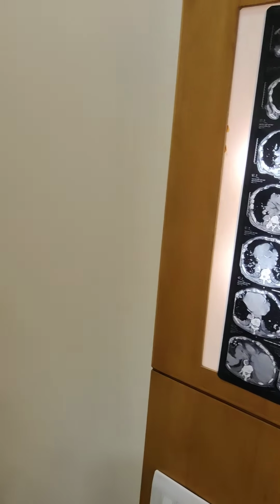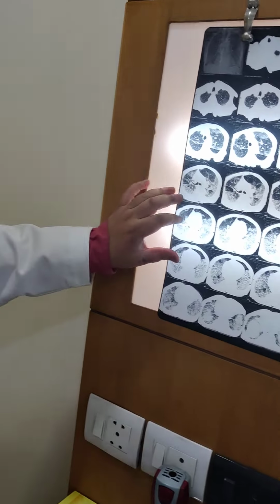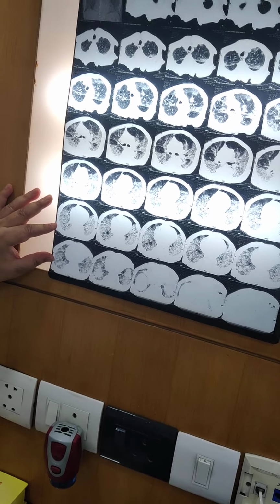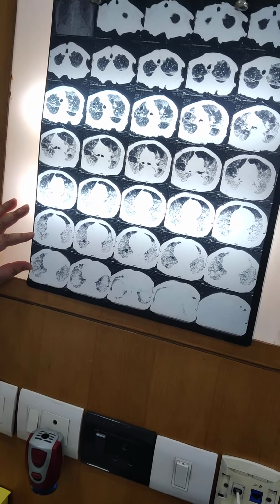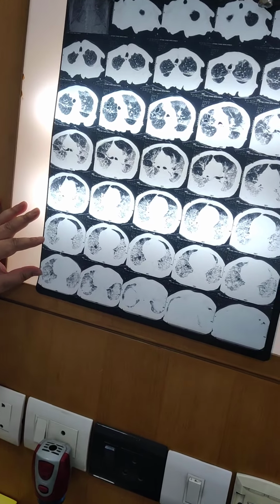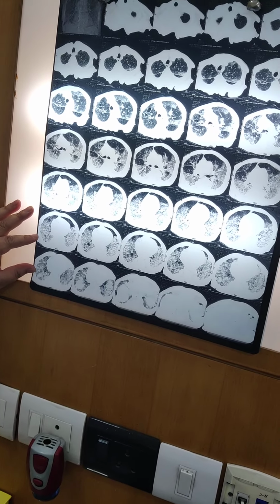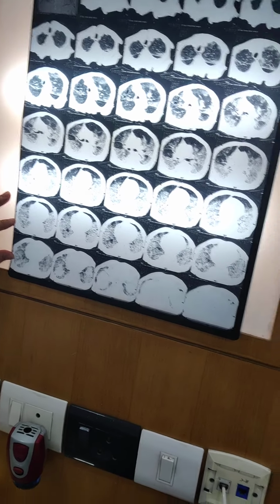And as I mentioned, if you go back to the first CT, typically, now I'll explain you what happens in COVID CT changes. These ground glass appearances are usually symmetrical, peripheral, and this is the hallmark of the disease. The second thing which you find in COVID is what you call traction bronchiectasis. I've already shared an article in the group. So traction bronchiectasis is another thing. Then you can have what you call crazy paving shadows. There are typical shadows.